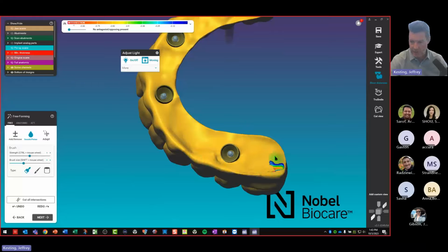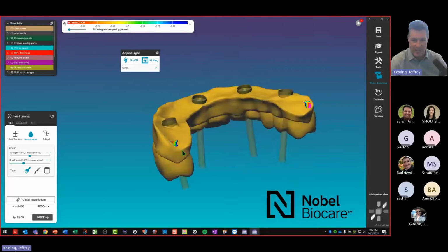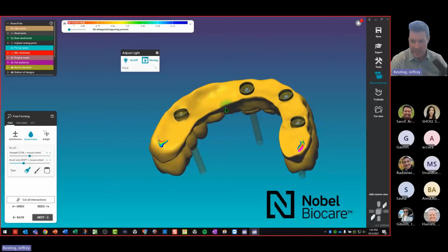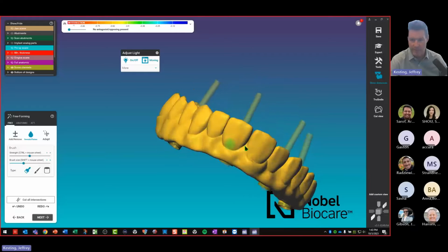And you can see here, that's our color coding to where we are relative to our jaw, right? You can bring this on as well, and you could smooth and flatten from here if you wanted to see it that way as well. I'm just going to continue to come around here very quickly and take that off just so it looks a little better here. You can make any adjustments you need to. I'm just getting rid of some of this ridge because this is a demo model we were working on, and it does cut into that ridge quite a bit. So I'll just take that off. Make our bridge look a little bit better here, maybe.